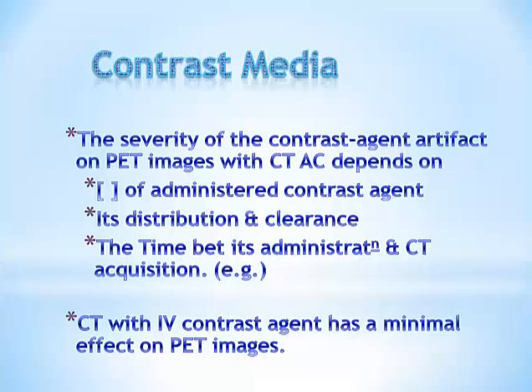that we are having a humongous artifact in our images. As a result, the high CT numbers of the residual barium overcorrect the attenuation of the PET emission data. And this will mimic an increase of the tracer uptake in our image, which will affect the interpretation of the PET-CT scan.